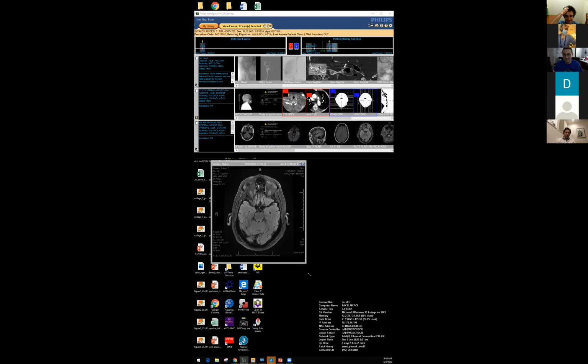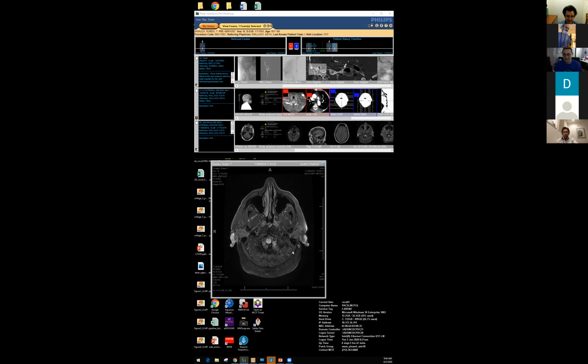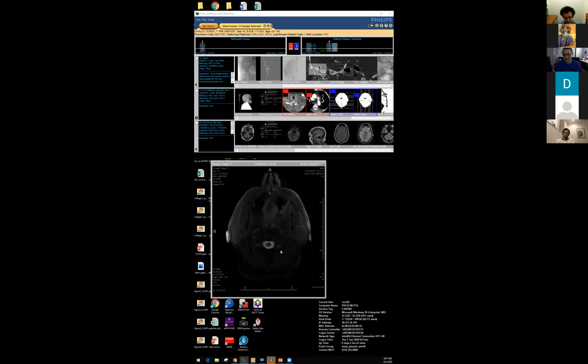This patient came in, actually from another institution after being followed for a while, with progressive weakness in all extremities and a lot of cerebellar symptoms, and the MRI showed this abnormality in the brainstem. You see on FLAIR there is this hyperintensity in the medulla and in the pons, and a couple of microhemorrhages in that location.